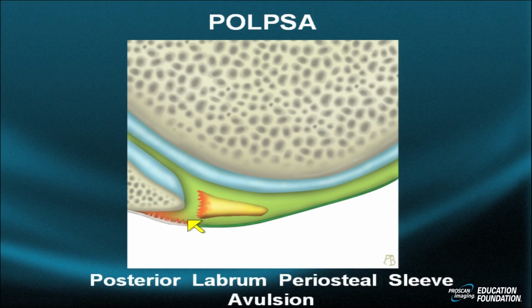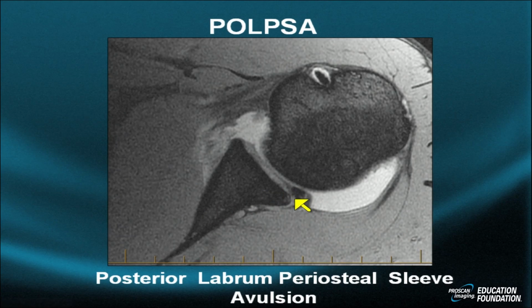Here's an example. The rift between the labrum and the underlying glenoid. There is some, in this case, traumatic plastic deformation of the posterior capsule. We know this because this is not a throwing athlete. And the periosteum is elevated or lifted off the underlying glenoid for quite a distance, much more medial than what we saw with the reverse Perthes or Kim's lesion. Yes, this patient also has innumerable anterior findings that will be described at the end of the summary.